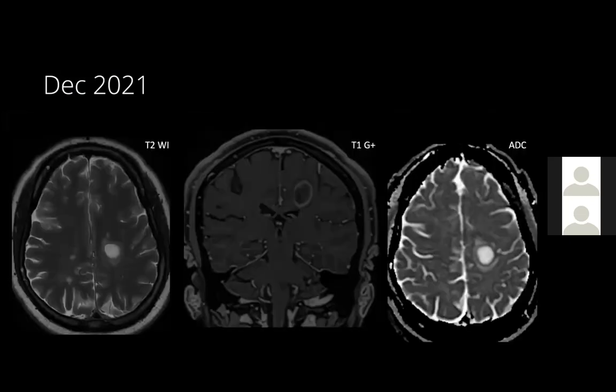This patient had no diffusion restriction in the center of this lesion. The lesion was T2 hyperintense in the periventricular white matter, and you can also see that it shows incomplete rim enhancement. Incomplete rim enhancement is typical for demyelinating disease, and you can see the deficiency of rim enhancement at the site of the ventricles.